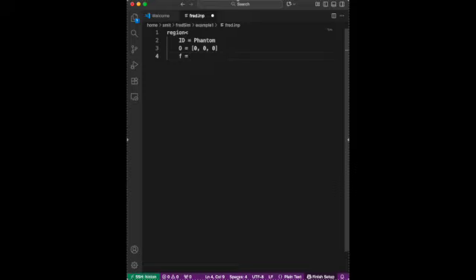forward vector, the direction in which the beam will go. Will it go in the x direction? Will it go in the z direction? Will it go in the y direction? By writing it like this, the third coordinate implies the z direction, so it will go in the z direction from the negative to the positive side.